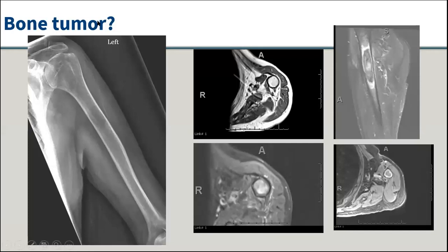Okay, now we have another bone lesion in the same location. You can see there's lucency, again, quite well defined, no sclerosis there. And you can see this bright lesion there. Looks like a hemorrhagic lesion again, and has some ill-defined edema or something around it. We do contrast, it shows peripheral enhancement.